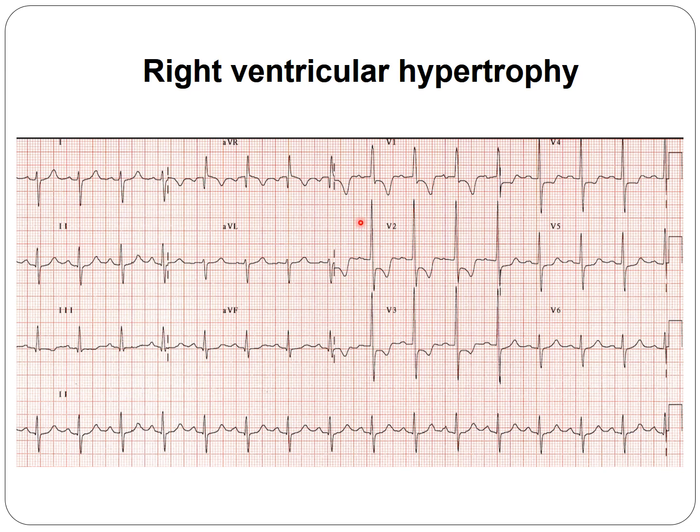Looking at the QRS complex, in V1 we see the R, in V2 we have a bigger R and an S wave, and if you look at V5, V6, the R/S ratio is less than 1, representing right ventricle hypertrophy. Here you can see that downsloping strain phenomenon in V1, V2, V3.